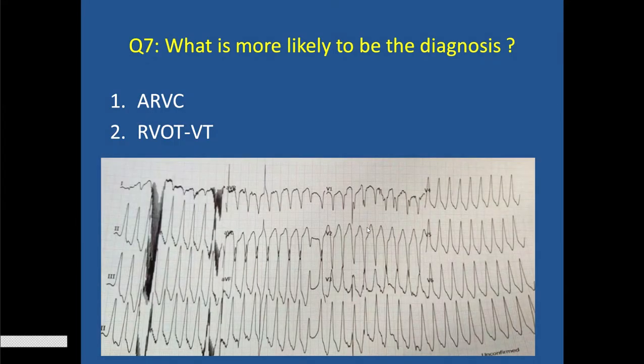This is another patient who was assured just 2 months before she presented to me, that the ECG is normal, echo is normal, and was sent back. The history was palpitations and giddiness. And 2 months later, she presents with frank syncope, and this is how the ECG was in our ER. Sorry for the disturbance. In the ER, all this happens.